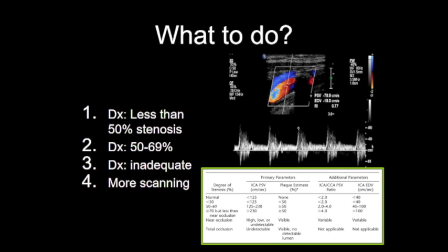So what do you do? That's an interesting question, right? I have 28 minutes, and I don't know how many cases I have, but let's talk about this for a few minutes. I mentioned this to the sonographer. I said, there's a big calcification there. And they go, yeah. I said, you didn't mention that there was a big calcification on the worksheet. They go, I know. And I said, kind of helpful to do that.